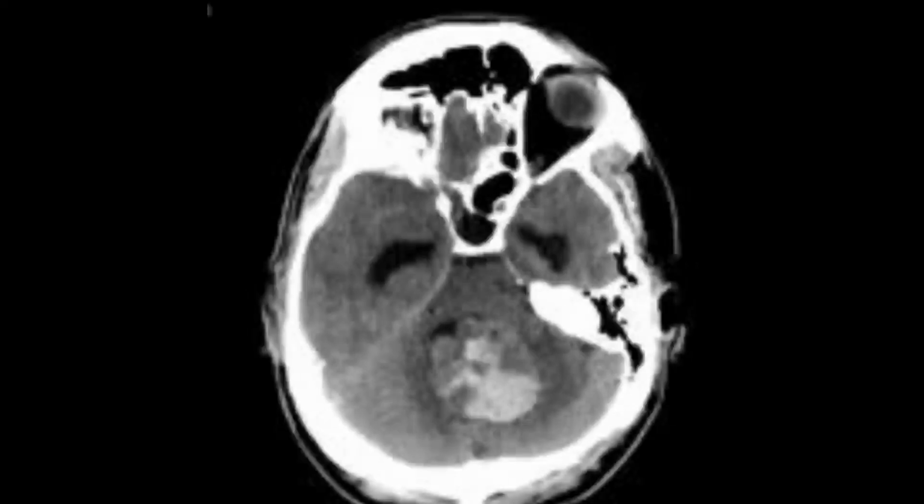Another post contrast axial CT image of the brain shows a posterior fossa, well defined, predominantly cystic lesion with a post contrast enhancing intramural nodule. You can see this is a cystic lesion. Within that there is an enhancing mural nodule, and it is causing significant compression on the surrounding parenchyma, resulting in surrounding edema. On the angiograph it will give rise to a vascular nodule within the avascular lesion. So this is a typical cerebellar hemangioblastoma.